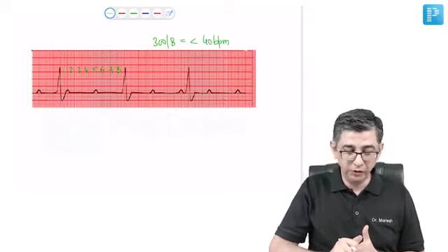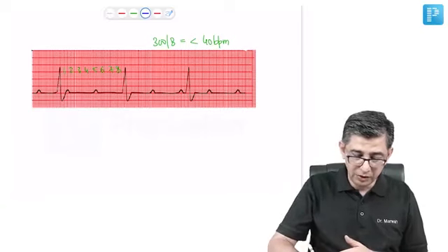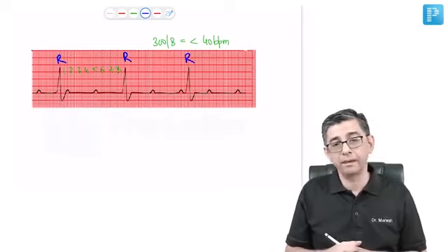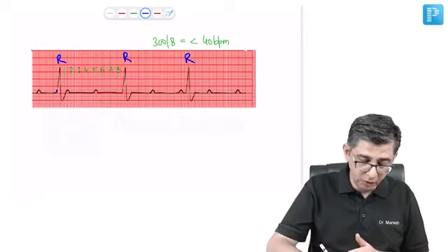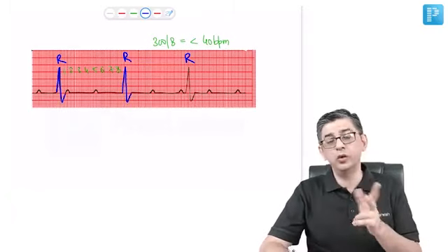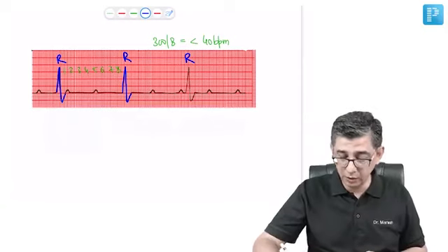And then what I'm noticing is that in this particular ECG recording, the number of the R waves that you are counting is only 3. Even the QRS complex of the patient is relatively broad. Every time there's a QRS complex that's broad. So I was teaching you broad QRS complex tachycardia. Now I'm teaching you broad QRS, but there's a bradycardia occurring in the patient.